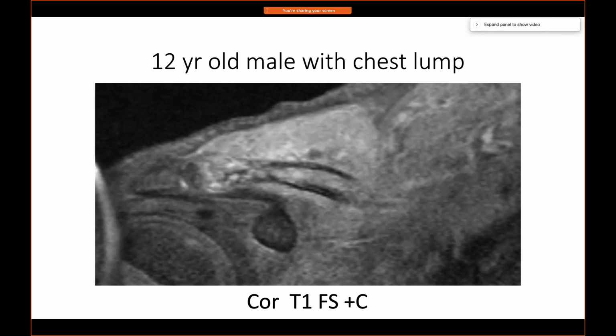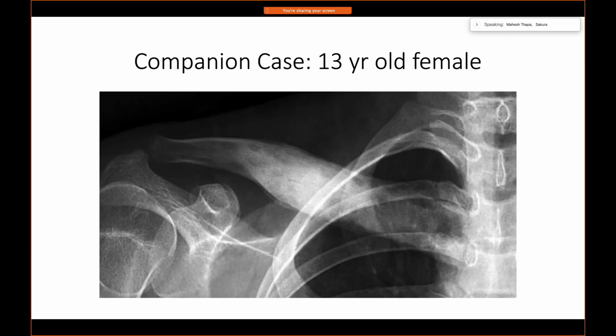Something aggressive like Ewing. Okay, good. I like that. Was that you on? Or? No, it's Cody. Oh, hey, Cody. Good job, Cody. Now, I'm going to show you another case.